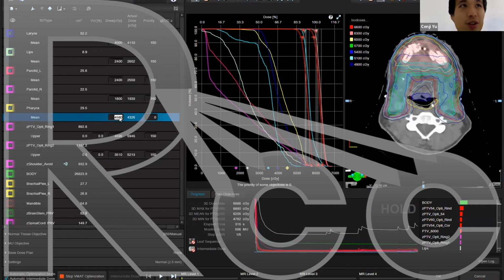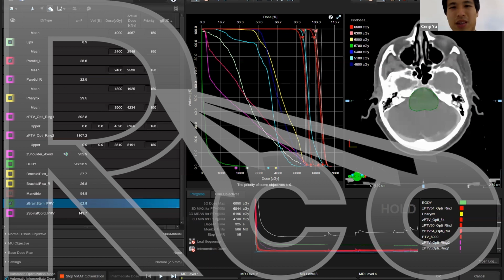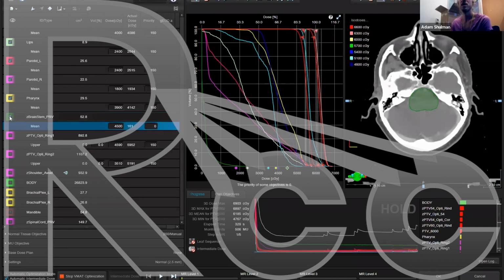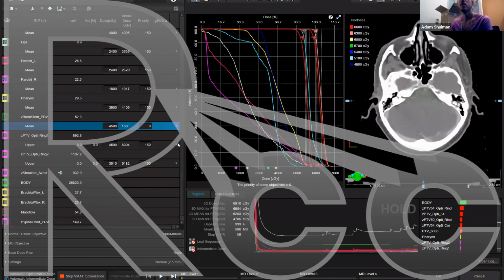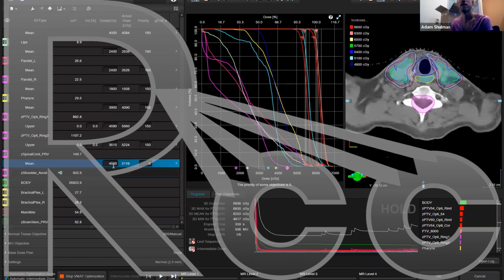Dr. Shulman, as you're tuning these, I have a private message question. Tenant was wondering why we should avoid the shoulder beam entrance. Oh, great question. Brainstem is far away. I'm going to forget about this. Sorry, one second. Let me just add this last. Spinal cord PRV. Again, this will help shape that neck dose. Yeah, great question.